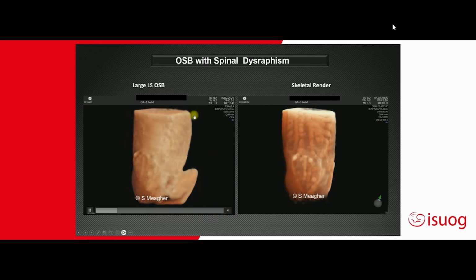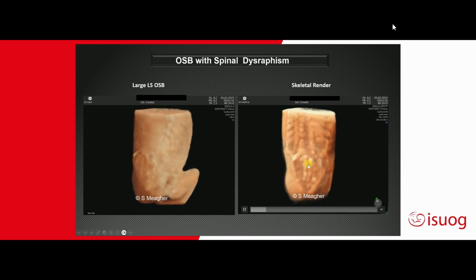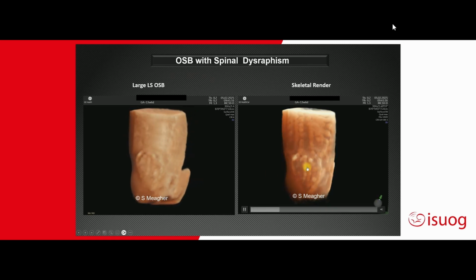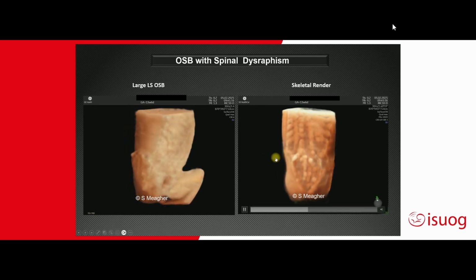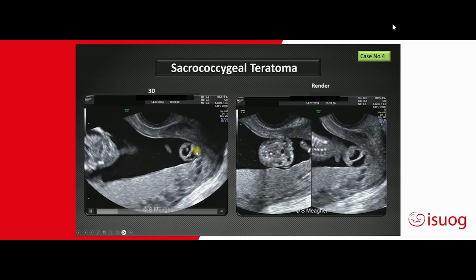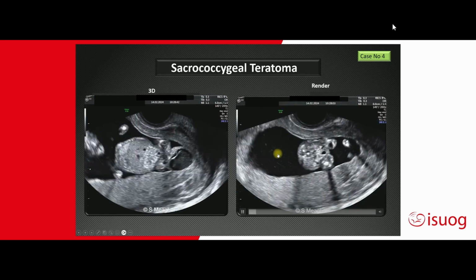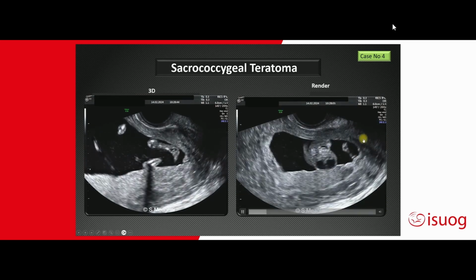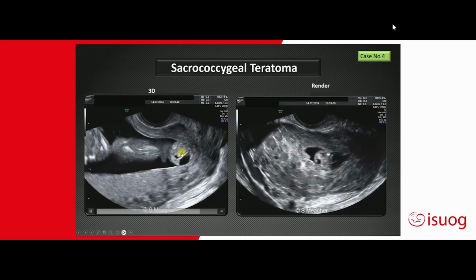And then there's the last group of the spina bifida, in which the spinal dysraphism, and this is frequently where you have a disruption of the spine, and some of these exist with the OEIS complex or either with the trisomy 13s and 18s. Differential diagnosis, remember you may have a cystic mass arising from the sacral bone, and for many of these they are pretty straightforward, but some of them may be challenging. This is solid cystic, and I don't think anybody in the room would confuse this with open spina bifida.